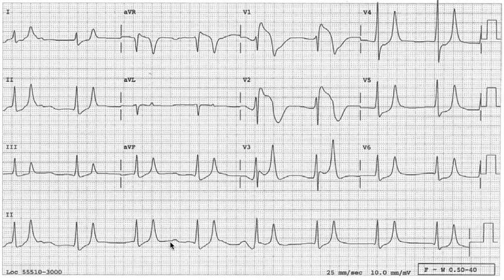We can also appreciate only one P wave here in this rhythm strip, and you can also appreciate there's a very prolonged PR interval from this P wave to this R wave. This prolonged PR interval is also typical for hyperkalemia. So why do we need to know this pattern of hyperkalemia? Why don't we just order potassium blood levels? There are actually two reasons for this.